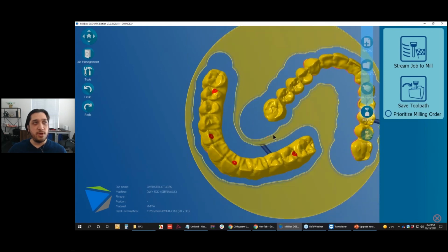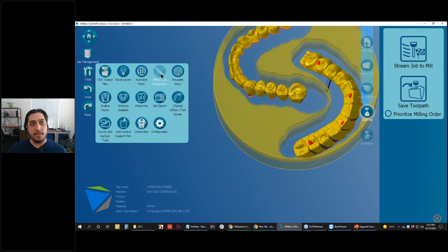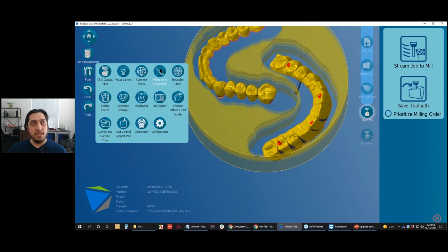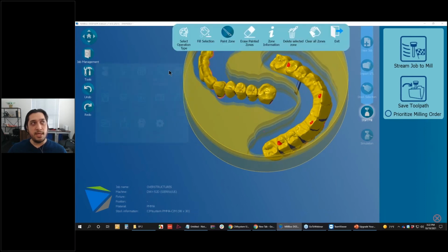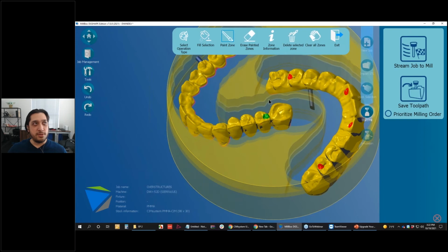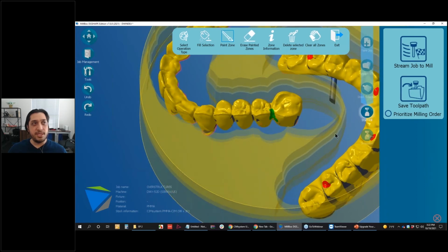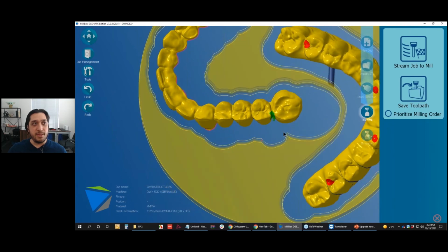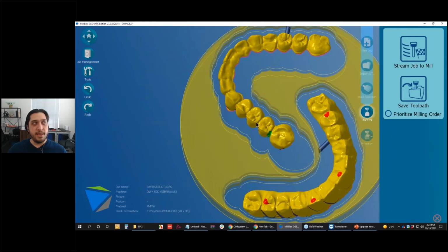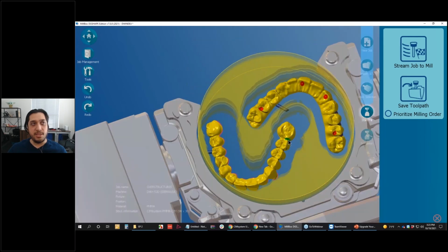And in some cases where I may need to designate additional ones, you guys that attended our episode 1 saw that we were using the milling zone designation tool to show how we could hit some of those areas. Just to recap that, I know this is not what this particular topic is on, but just to show what we can do, we can come in and designate additional external finishing features here if they need to be milled out. And as you can see, it opened up that offset. So if you want to see a little bit more information about that, definitely check back on the recap for episode 1, and that'll bring you up to speed on how to use that additional milling zone designation tool.